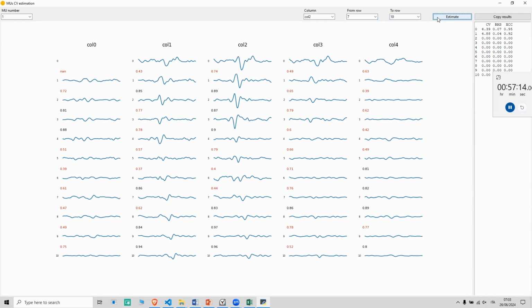As I said, channel selection is maybe the most challenging part because we need to observe many waveforms and signals in order to get familiar with them, in order to instantly identify an innervation zone. So it takes time. But I think that Giacomo and Paul have done an excellent job in simplifying as much as possible, at least the part of the signal analysis in openhdemg.